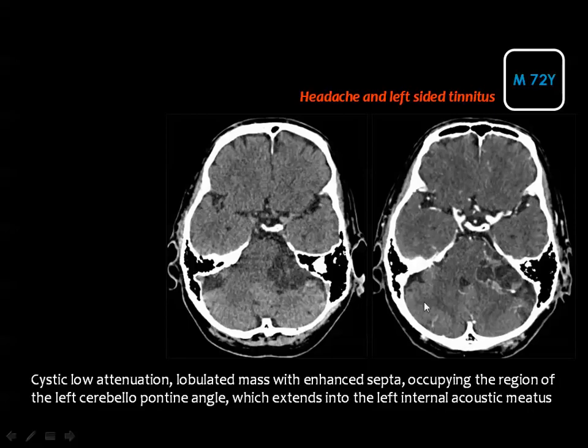Axial CT scan of the brain before and after contrast injection, showing a cystic lesion at the cerebellopontine angle, and this lesion is extraaxial because the ipsilateral cistern is widened. Then you see marginal enhancement after injection of contrast. Now diagnosis?